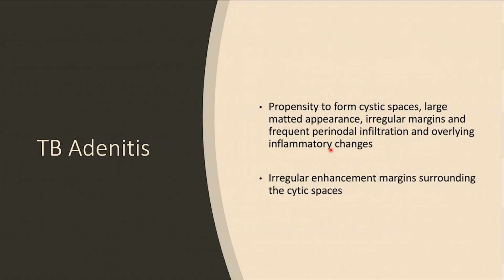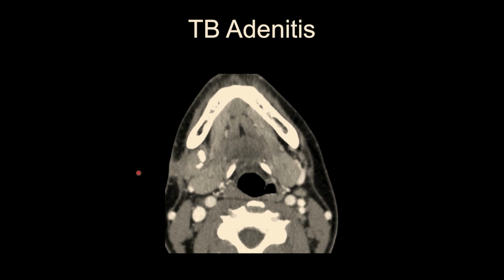Again, this is my differential for cystic lymphadenopathy always. They're large, matted in appearance, with irregular margins. The demographic should fit if you're suspicious about TB sometimes. Calcified, periadenitis, unilateral stuff. This was the case of TB adenitis I showed you a little bit earlier.